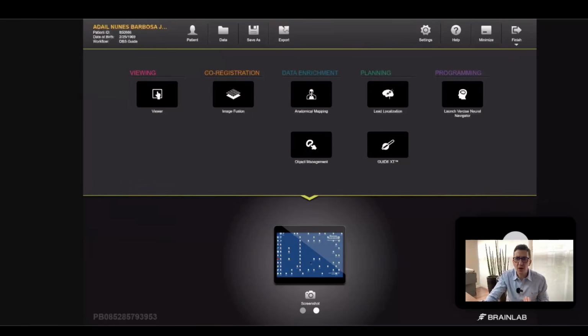The STN, the GPi, the VIM, or whatever nucleus you are using in your patient, you have to prepare in advance before you move to the settings. So in this class, I'm going to teach you how I slice, how I prepare my STN, how I cut my STN in the tablet. And then in the next class, we're going to discuss how I start the programming itself. So let's go to the programmer of Boston Scientific. That's the StimView software. And then we are going to discuss how you prepare your nucleus.